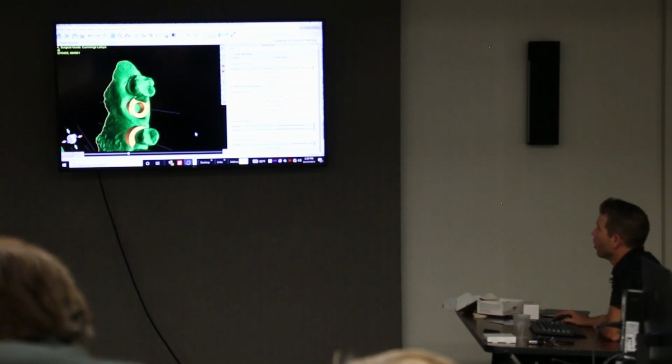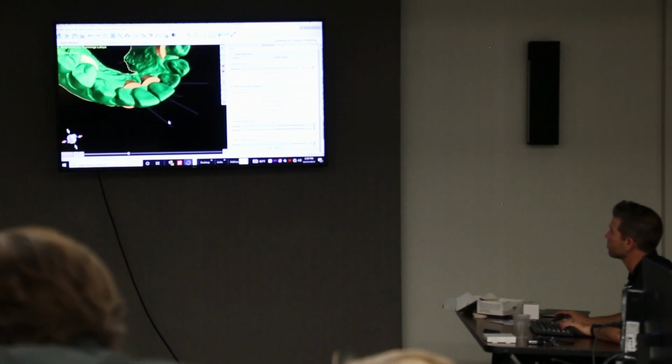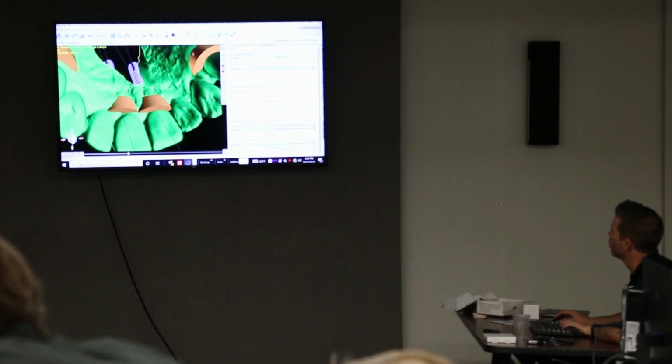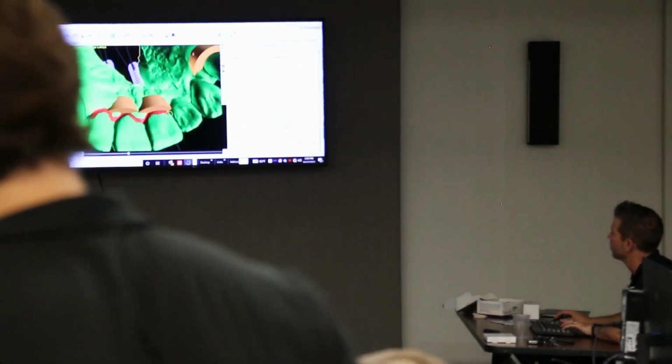So if anybody wants me to do this again, I'll do this in real time in this front one. So I'm going to remove all 4 of these front teeth here. And so I'm going to run through, and I can do this all at the same time. So just get these close here. I'm just going to go through it. I'm just going to dig all 4 of these teeth out of here.